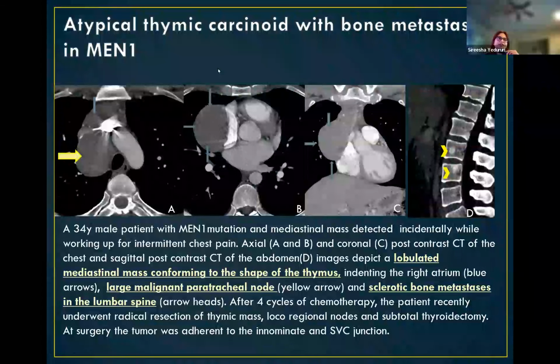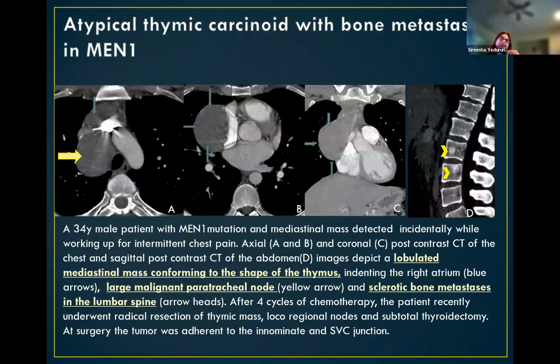And then atypical thymic carcinoids. Atypical thymic carcinoid with bone metastasis.